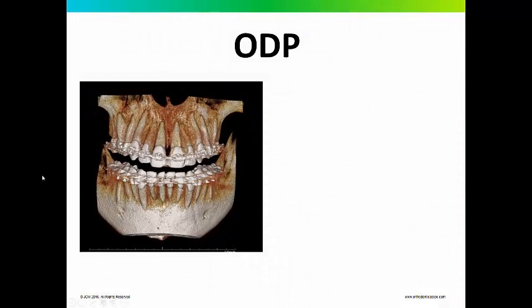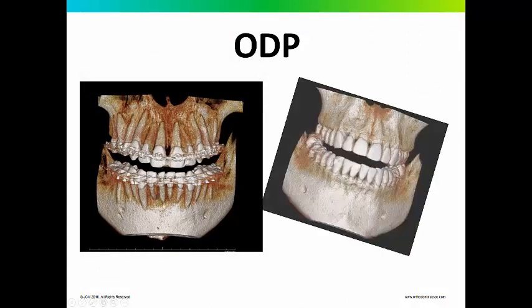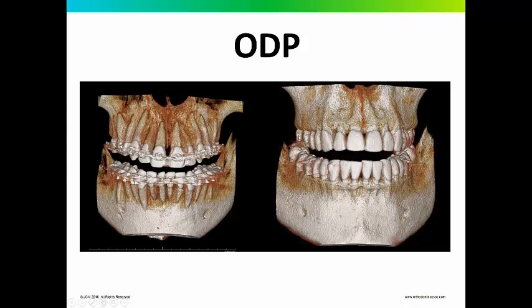In this particular case, if you compare it to another patient, these 3Ds were set at the exact same settings and were taken with the same exact settings. You can see the difference. Now, typically the 3D reconstruction is not diagnostic. It just gives you an idea or a feel for what's going on on a global scale.